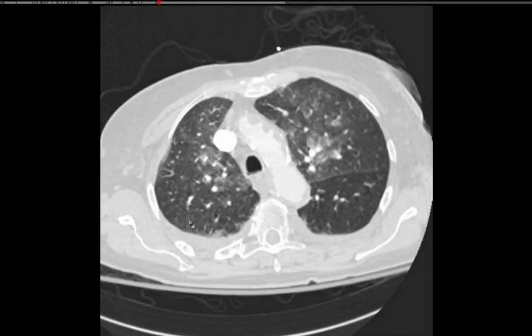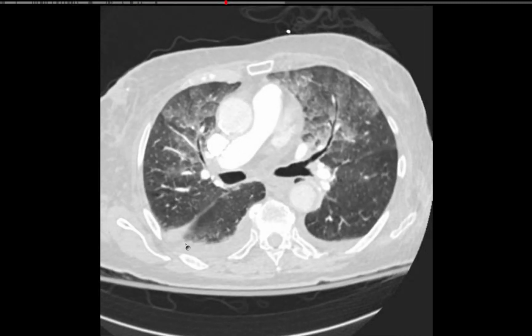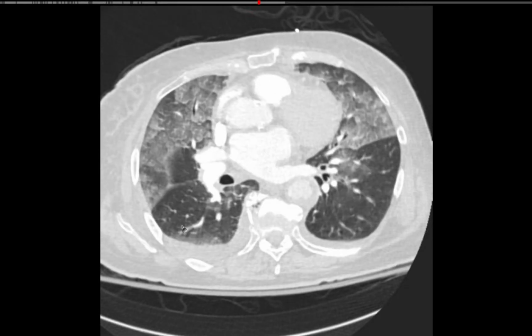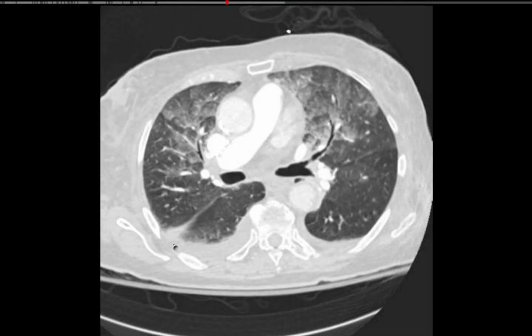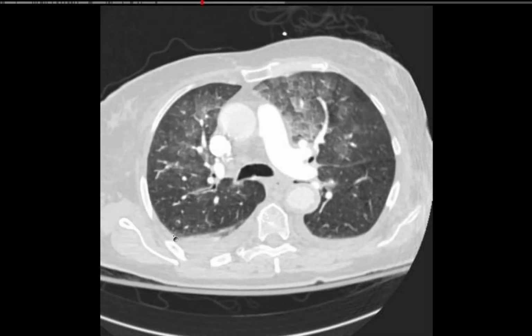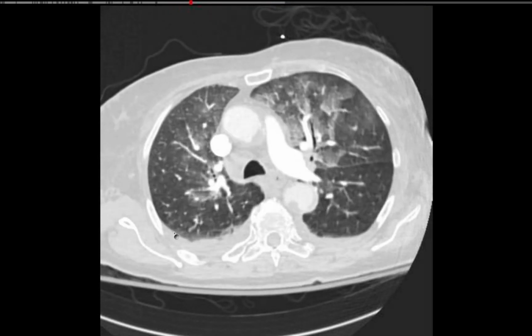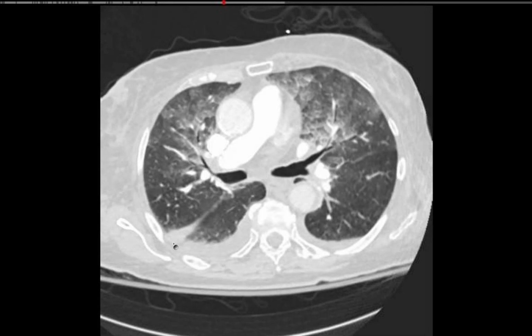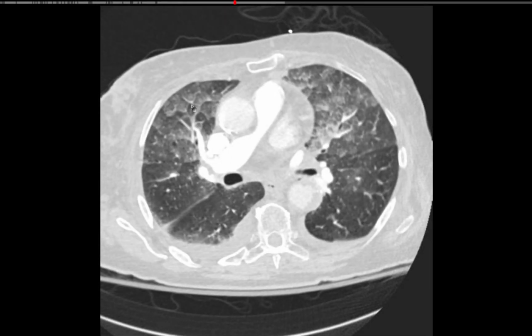And while we have quite a bit of alveolar edema and almost no interstitial edema, which is also a little perplexing for ordinary everyday hydrostatic lung edema. So I don't know the answer to that. Does the patient have regurgitation of any kind? Not that I know of. No, I don't think so. Mitral regurg? No, I don't think so. So certainly curious.